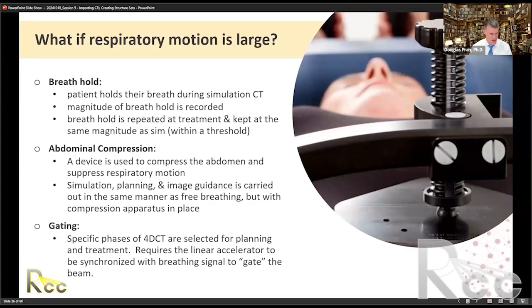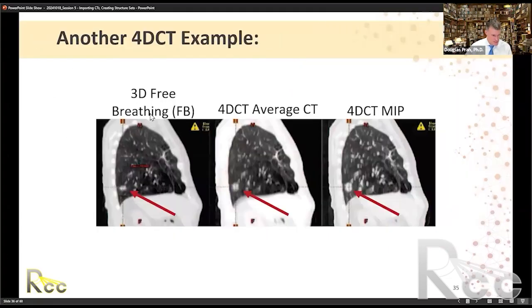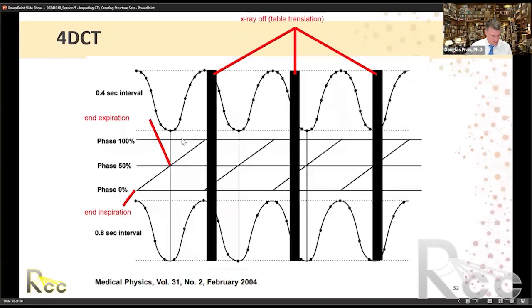So we've got a couple of options. If you look at our protocol for our CT scan on the website that I mentioned earlier, so this is a good question: what makes a 4D CT a 4D CT? That goes back to this.